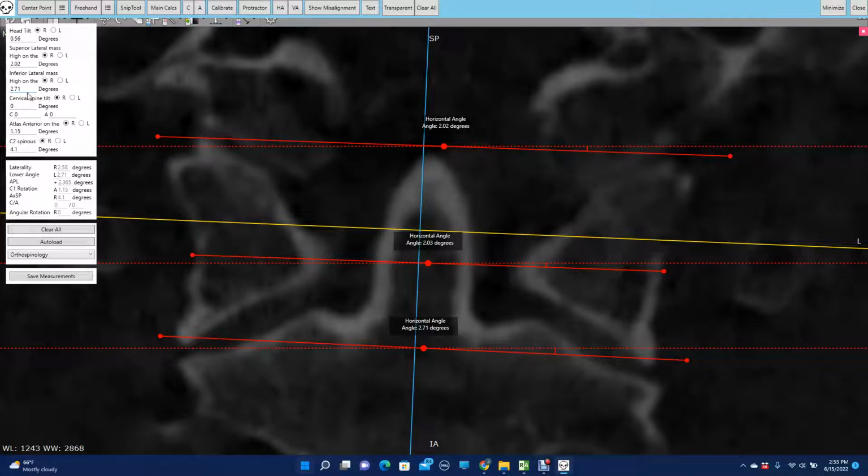It will average these two out to tell you what your working plane line is for your math and your setup. I call this method the triple plane line method, and this is kind of how I'm doing it, if you wish to. We have now measured the plane line. We've measured quite a bit. We need our cervical spine tilt, our C over A, and then our wrap up. Pretty quick little analysis if you just work your way down the chart. And I am showing you my method for doing this. I don't necessarily think this is the best method of doing it, and we continue to learn more as we use this technology and become more familiar with it.